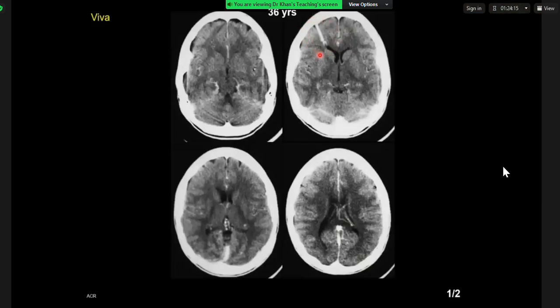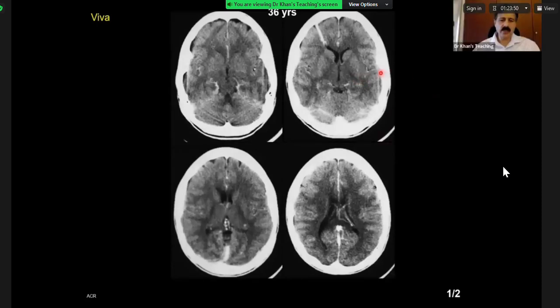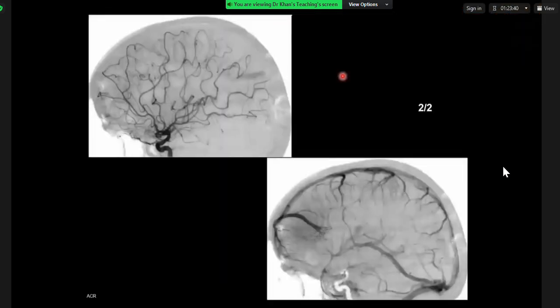This looks, on the angiogram, like it is enhancing uniformly, and I can't see it on the lower slices, so it's above, just at the level of the lateral ventricles in the right frontal, but it's quite well defined, and I'm trying to think what anatomic location it's conforming to. It's a very straight line type of structure.